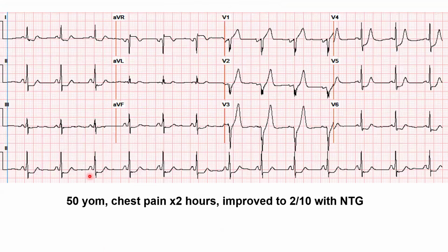This is the de Winter hyperacute T wave here in the anterior precordial leads. You have that tall T wave exceeding the height of QRS in leads V2 and almost in lead V3, along with the Q waves in leads V2, V3, and along with reciprocal ST depression in the inferior and lateral leads. And along with ST elevation in aVR, which indicates basal septal injury as in left main or proximal LAD, and in this particular case, it was a proximal LAD.